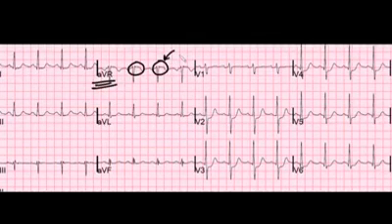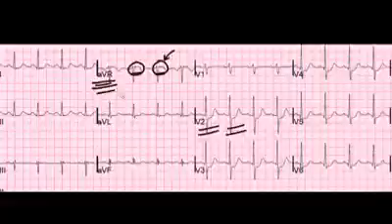And you can see here that this is kind of giving it away in the sense that you've got precordial leads with ST segment depression, and you've got this AVR with ST segment elevation. Now, be aware that if you see ST segment depression in AVR, that, along with tachycardia, is usually going to mean pericarditis. But that's not what we see here. We see ST segment elevation.